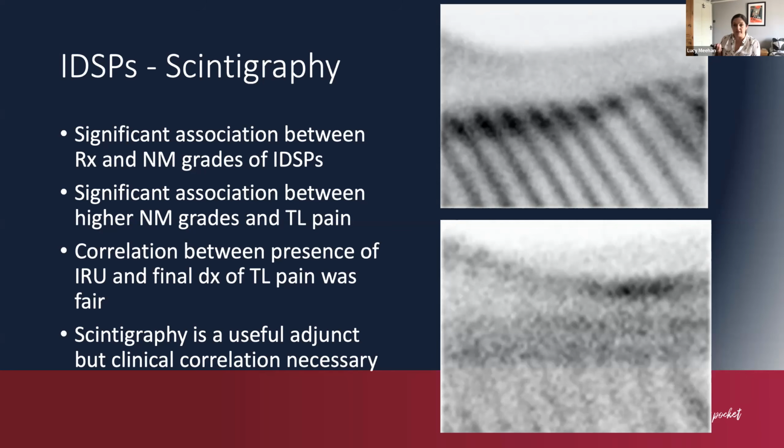Increased radiopharmaceutical uptake has been reported in normal horses. Radiographic change has been reported in normal horses. So I think both of them are very, very useful to help us put pieces of the jigsaw puzzle together, but we do need clinical correlation to assess whether or not these kissing spines are significant. I like to block them, so I'll often block them under saddle. I think obviously palpation and response to back flexion is also an important thing to take into account.